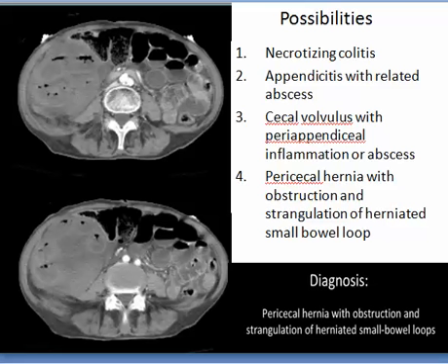So now you know 3 sites for internal herniation: right paraduodenal, left paraduodenal, and pericecal, and all of them have such an appearance, an area of crowded loops together, filled with fluid, delineated with minimal air, and showing the tubular structures of intestinal loops at an odd, abnormal site.